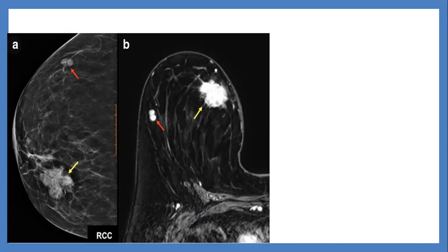Okay. This is a mammogram and an MRI study of the right breast, CC view, and MRI T1 with fat-sat, T1 with contrast. There is a large, ill-defined, hyperdense mass located within the medial side of the right breast, or the inner part of the inner mid breast.